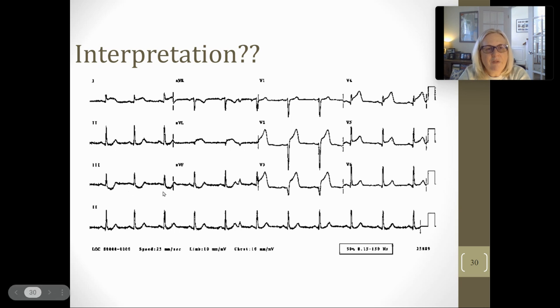2, 3, and AVF, there's definitely a change here. But do you see something that we talked about earlier? It looks a little bit like ST depression, but it's not. It has the scooping effect. So what's the scooping called? See the scoop and the scoop and the scoop? This is digitalis. So I know this person probably takes digoxin, and I can ask them outright, do you take digoxin? Or I can look them up in the system. This is digitalis. It's not necessarily ischemia. It's caused because they take digoxin. So it doesn't mean it's diagnostic. It just means they take digoxin.